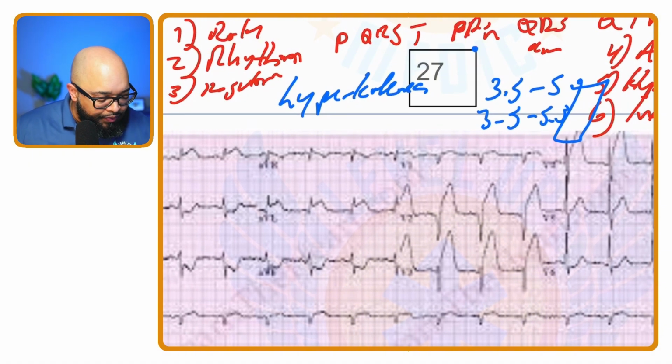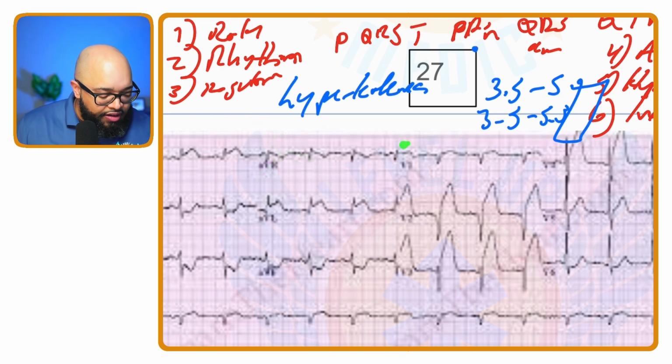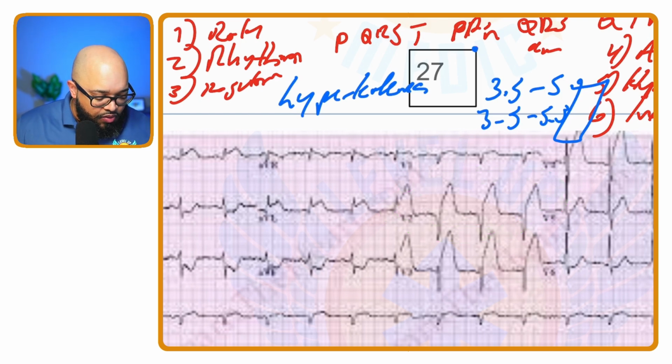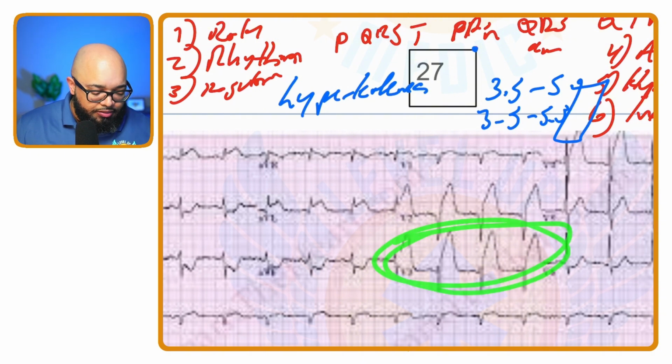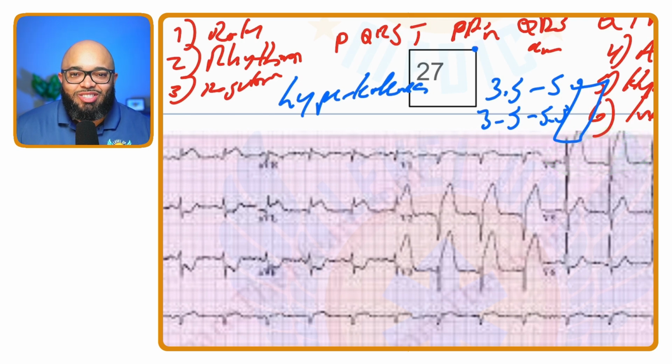Let's look at V1. Now, AVR by itself doesn't really tell us much information. Well, V1, I don't see elevation there. And what about V2? Do we have elevation there? Okay, what about V3? What about V4? Okay, so here I've got several things going on. I've got elevation in multiple leads, in the anterior leads and the lateral leads. This is actually that classic example of the widowmaker.